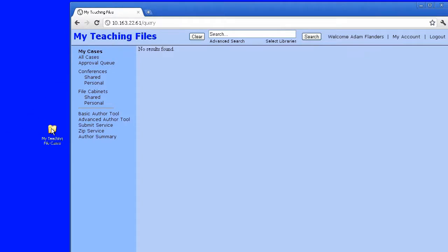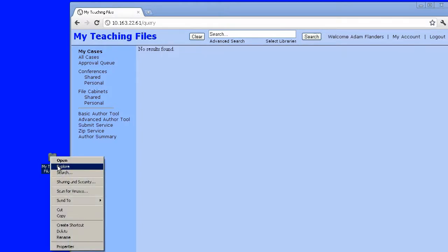What a lot of people have done is basically, in their daily clinical work, maintain a folder with a lot of nested subfolders inside of it with a lot of interesting images that they may grab during a clinical day, save it on their desktop, maybe put it on a USB stick, keep it in their pocket, and as they work every day, maybe save a few images in there. And I'll show you what I mean.